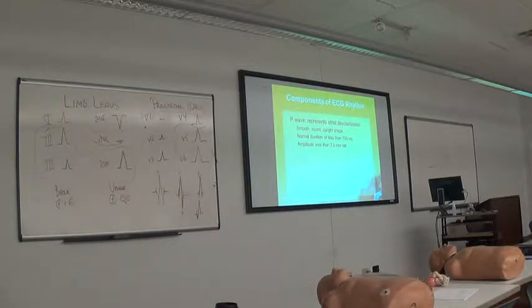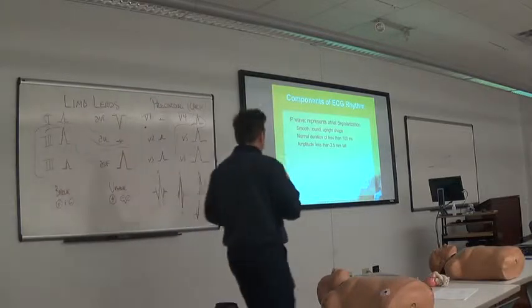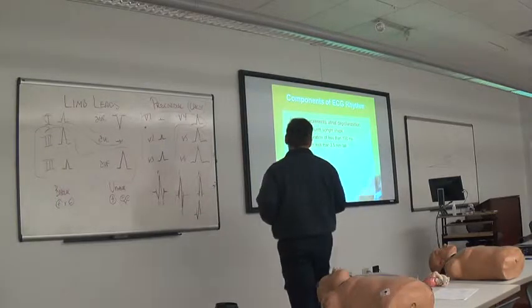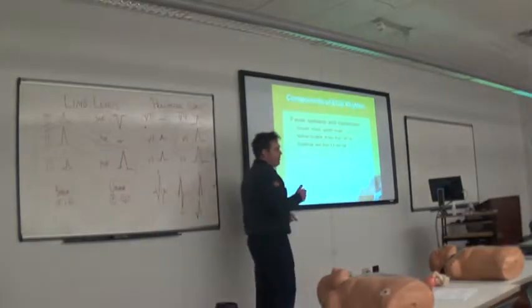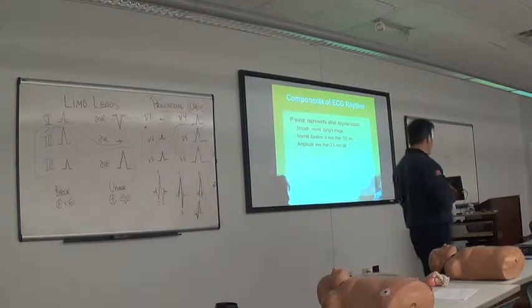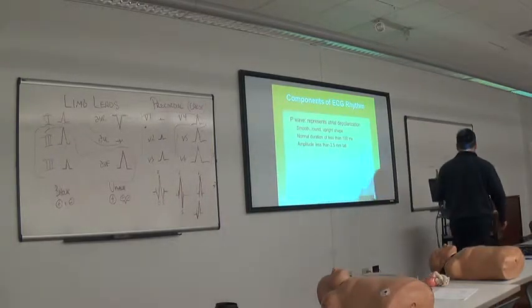Okay, so we're just about ready to get into actually looking at some strips, but first we need to cover just a few more basics. First of all, let's break down each one of these waves real quick. I mentioned the intervals and how we're going to measure them, but let's talk briefly about what's normal, or when should we be concerned.